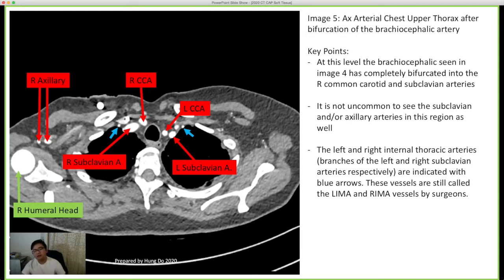Something that I really dislike is if someone tests a student and doesn't allow them the ability to scroll up and down. I think it's very important that when you are learning, you take charge, grab the mouse, if you ask them of course, and scroll up and down to see which direction those vessels are heading.